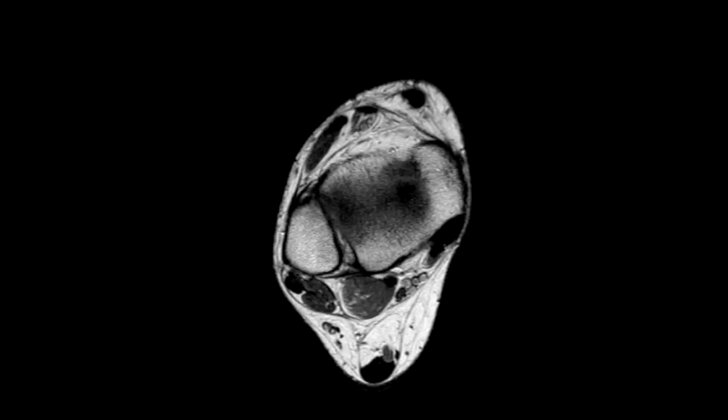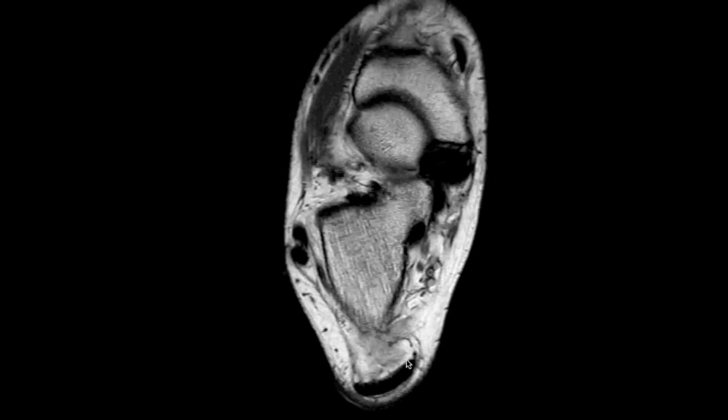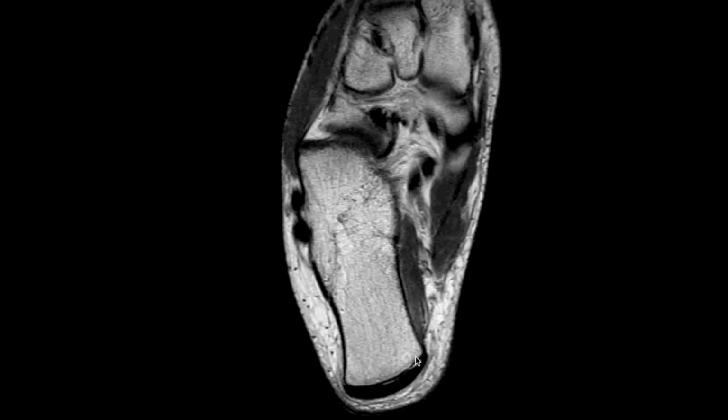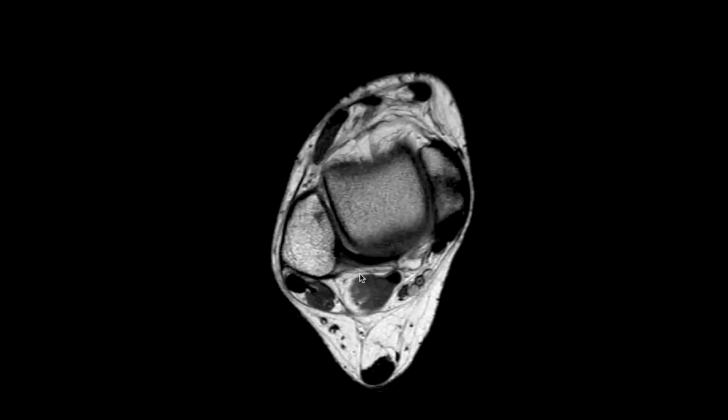Medially, you'll often see a small separate tendon, which is the plantaris tendon. The plantaris originates proximally from the femur, above the level of the knee joint line, and it goes from lateral to medial. So it goes from the lateral aspect of the distal femur, and then it will travel medially to insert medially onto the calcaneus. So here's a nice view of the body of the calcaneus with the Achilles insertion.